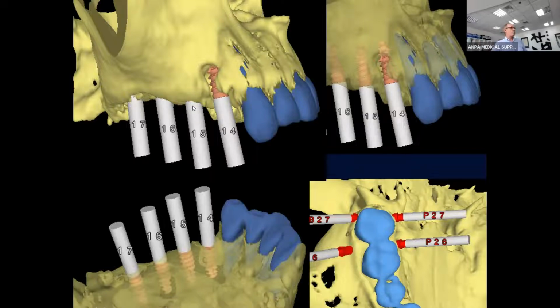So this is what we need to study, and we can study that on the images. In some other cases, like at the bottom right here, I can place some orthodontic implants to modify the position of the teeth without wearing a big appliance over the head of the patient. We just put screws in the right position, and I will show you how we do this. Because if we work with some orthodontist close to you, it will be very helpful for them.